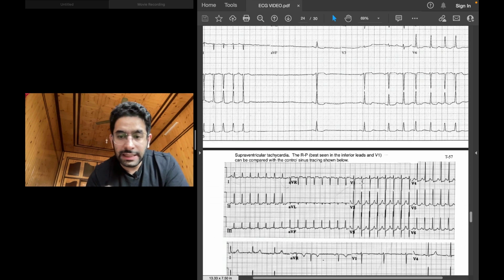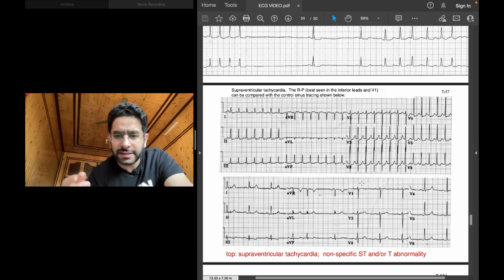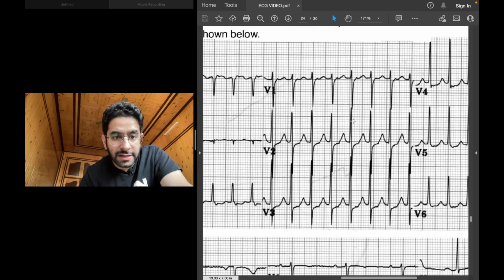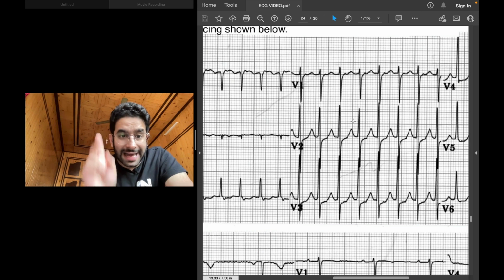Okay. And then this ECG, there are just a few remaining now. Now we're coming to tachycardias, the tachyarrhythmias. This ECG you can clearly see is fast, right? It is quite fast. You're not able to appreciate any P waves clearly, okay? And it's narrow complex, and it's regular.